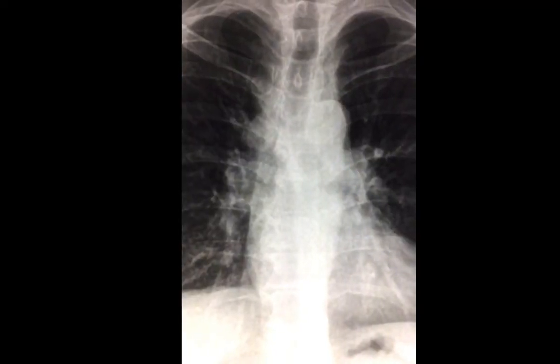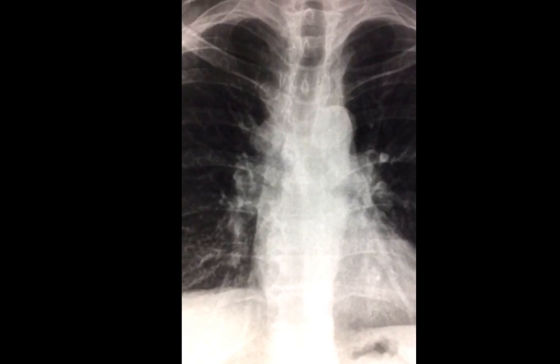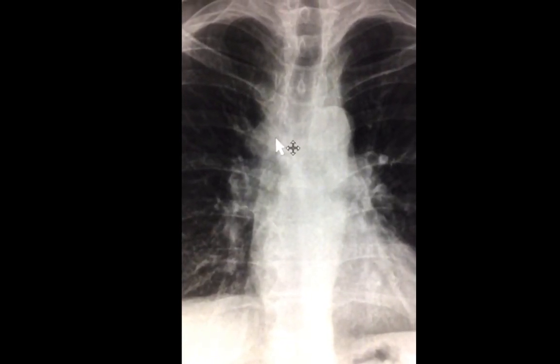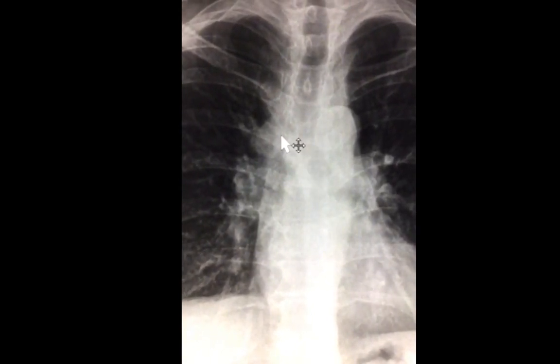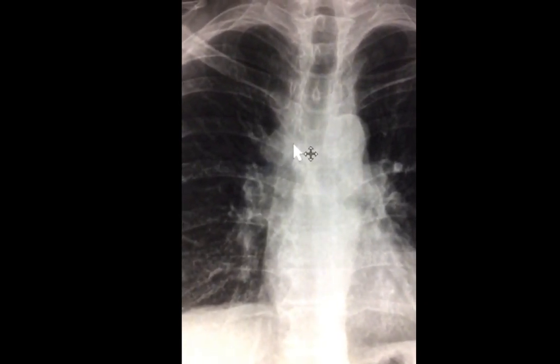So we learned from this case that one of the things that you should assess on chest X-rays is the contour of the mediastinum. We also learned that the azygos lives in the right tracheobronchial angle. A bulge in this region could be due to a dilated azygos or due to other structures. By other structures, we mean mediastinal, such as lymph nodes, pleural, or lung parenchyma.